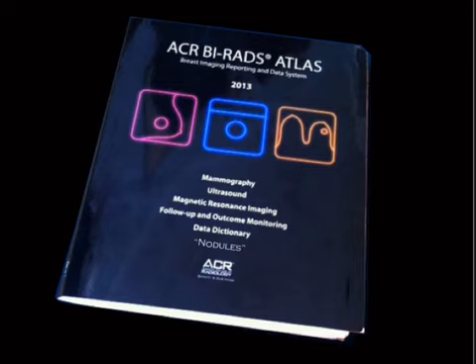The general idea is that they can't have people going around calling stuff breast nodules, that they have a standard vocabulary where a certain description of a finding is going to be true in one half of the country as it is in the other half of the country if you're using the words correctly. So these vocabulary words exist for plain film mammography, they exist for ultrasound, and they exist for MR. I'm just going to go through the plain film ones and the ultrasound ones real fast.